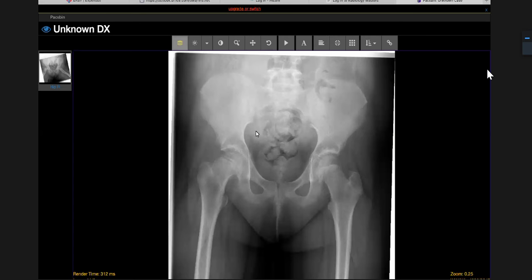Now that should go through the femoral epiphysis. And if you compare on the other side, the left side, you can see if you draw the same line on the lateral cortex of the femoral neck, do that with your mouse, that's going through the epiphysis, isn't it? And on the right side, it's not. And there's something else on the right which is abnormal.